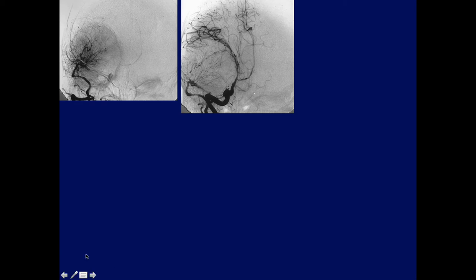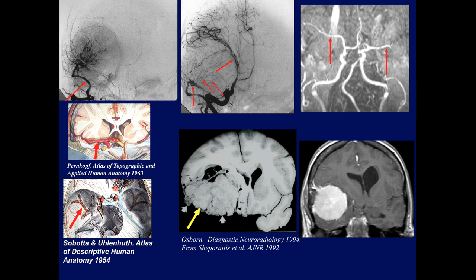As Gino says, markedly enlarged selective injection of the middle meningeal artery, showing it's enlarged, supplying a tumor here, and again middle meningeal here, showing the striations I talk about of the vessels, the so-called radiating or sunburst appearance of the middle meningeal branches, classic for meningioma, and we see the middle cerebral artery markedly elevated, again curved, classic for a very large sphenoid meningioma or pterional meningioma.